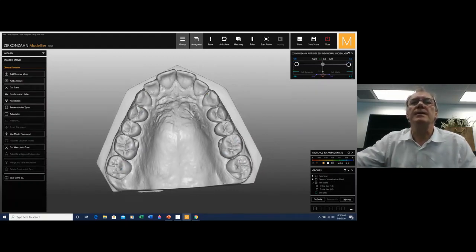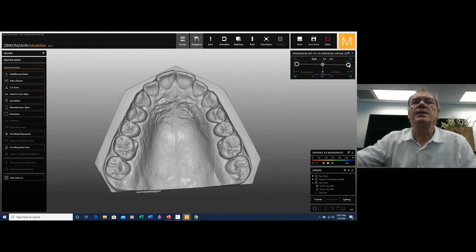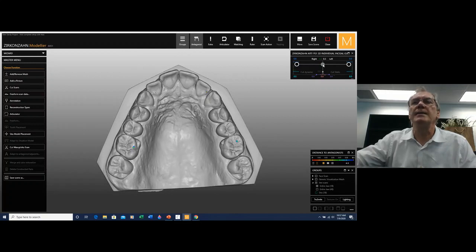We notice that there's a pre-contact on this molar while the canine is guiding the movement. The contact increases, it gets a little bit stronger, and at a certain point it just disappears, and the canine carries on taking the movement all the way through. If we evaluate the protrusive movement, we see that the canine helps, and at a certain point, two contacts come out on the first molars.